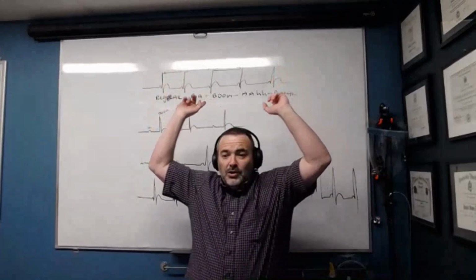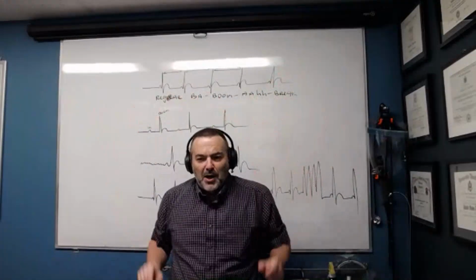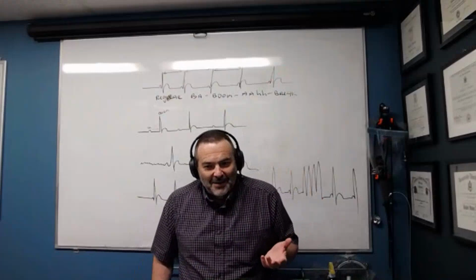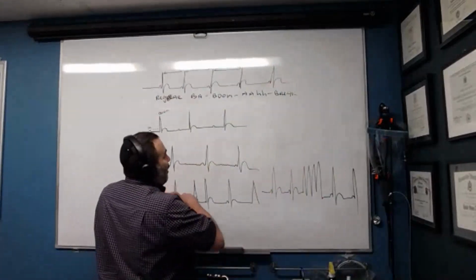Always compare everything to your top line. If it's not regular, it's irregular. And then you have to ask yourself a question: how irregular is it? Oh, how about this one? How does this sound to you?